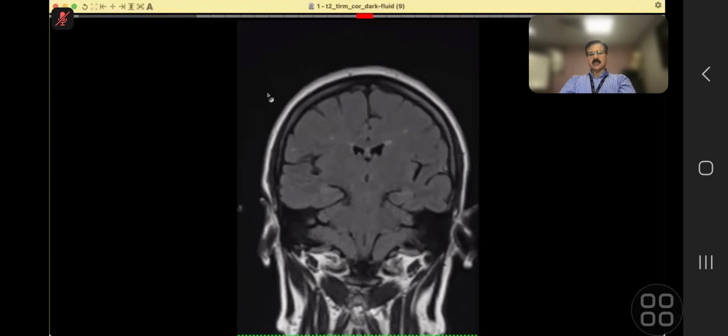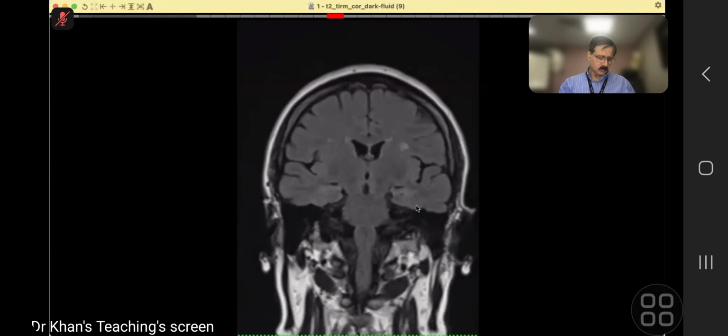The patient on a DWI sequence had no abnormality, but had some visual disturbances, 66-year-old. I'm showing you a sequence. Over to you. So I requested for the remote control. Yeah, it is with you. Thank you, sir.